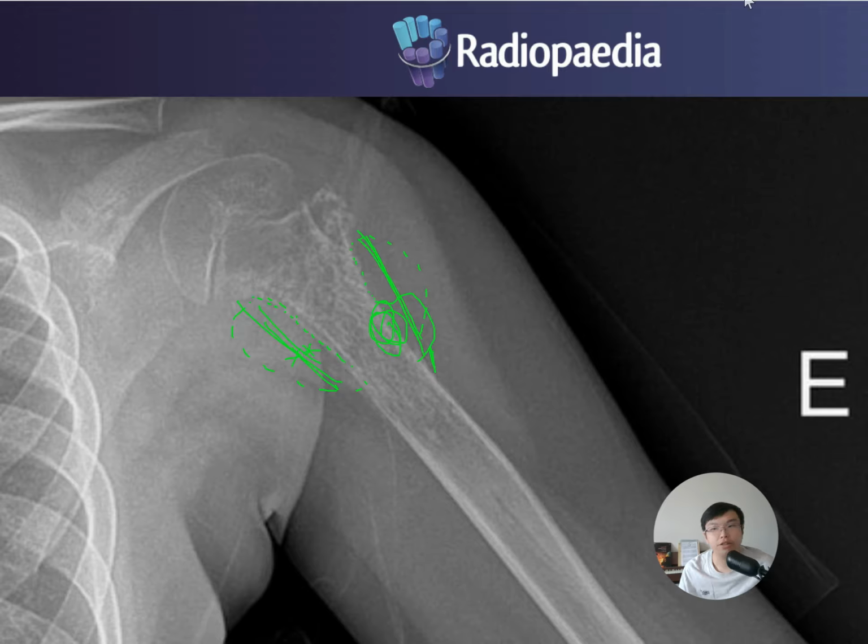So they're not black and white, they can exchange as you see. Codman triangle is also seen in this case of a Ewing sarcoma, but this is the more classical scenario, okay. And then we know that basically the trabeculae here is sort of eroded, with a permeative appearance, and then we have some destruction of the cortex with some laminated aggressive periosteal reaction.